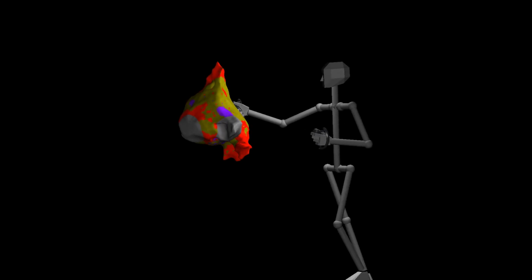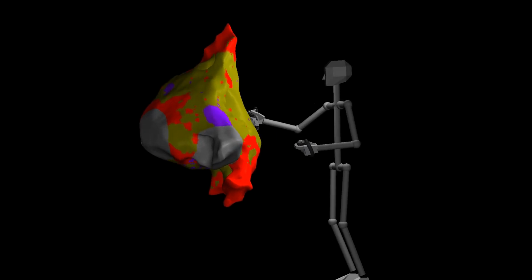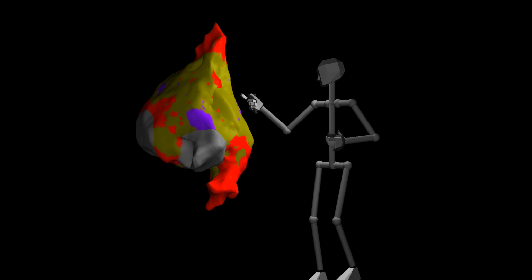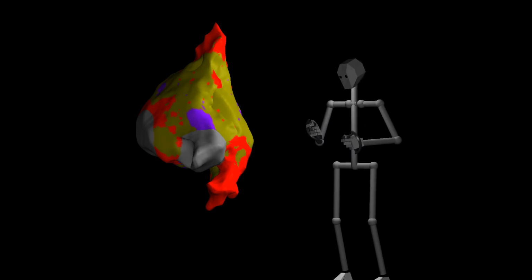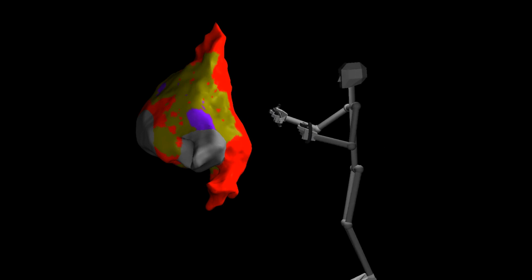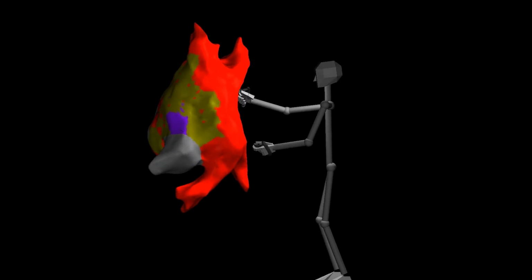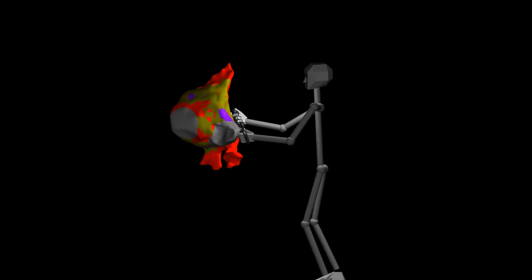And as you can see, first of all, the 3D shapes, even though they're measured independently, line up very well, which is good because it is, after all, the same heart. We are hoping that the measurement doesn't shift during the procedure. So I'm going to hide the pre-voltage mesh now, and what you can see is that there's a difference in voltage distribution. You can see this very big red area here, and you can also see that there's a lot less of that purple that we had before.